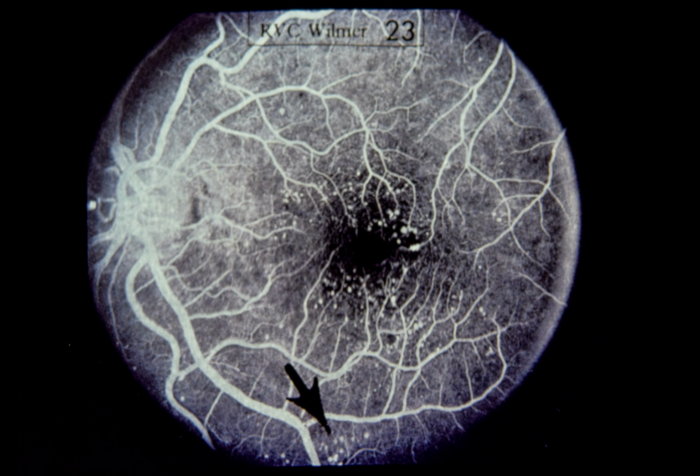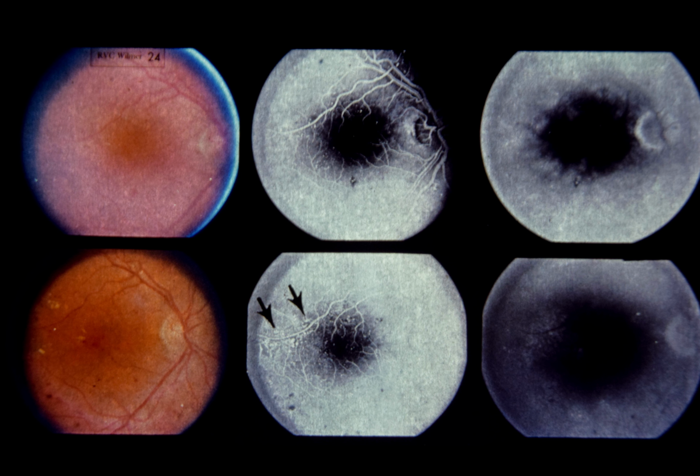Slide 24. Progression of background retinopathy. Serial color and fluorescein fundus photography enables the ophthalmologist to document changes in fundus pathology. This 39-year-old white female has had diabetes for 12 years. 2 years ago, visual acuity was 20/20 in each eye, and only scattered microaneurysms and hard exudates were seen. Photographs above were taken in July 1974, and photographs below in July 1976.